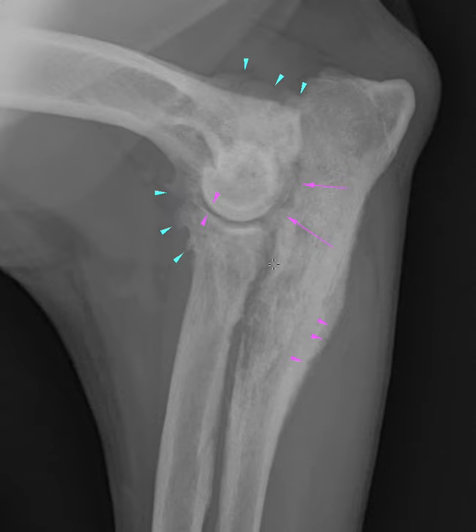In my opinion, what we're dealing with here is a process that's centered on the ulna. What I'm very confident about is that this is an aggressive lesion. I believe it's centered on the ulna, so I would categorize it as monostotic. It's unusual for a monostotic lesion to go to the joint. So this has some criteria that overlap between a primary osteosarcoma and perhaps a primary joint-based neoplasm. Sampling would be needed for definitive diagnosis, and I would recommend sampling the bone as well as the joint fluid to determine which was the primary process and rule out the unlikely chance that this could be a septic arthritis.